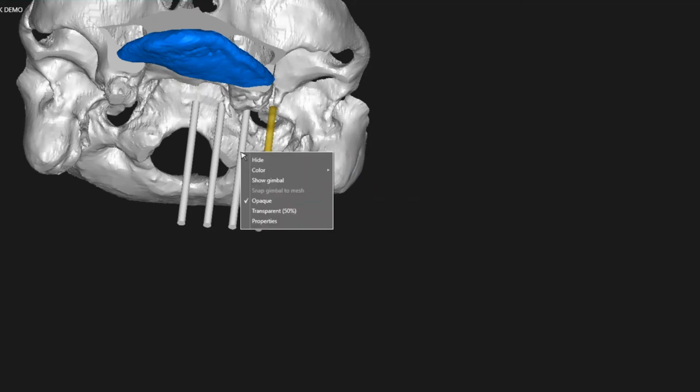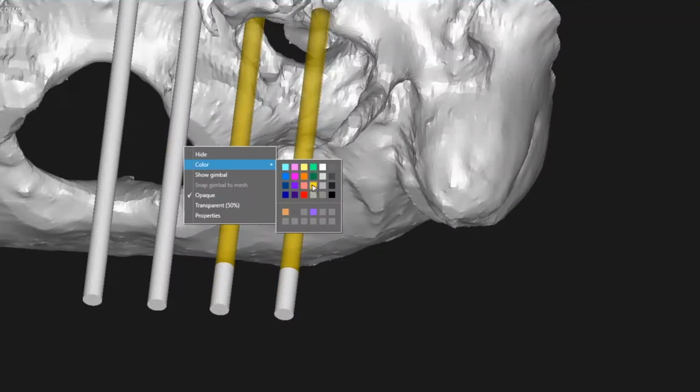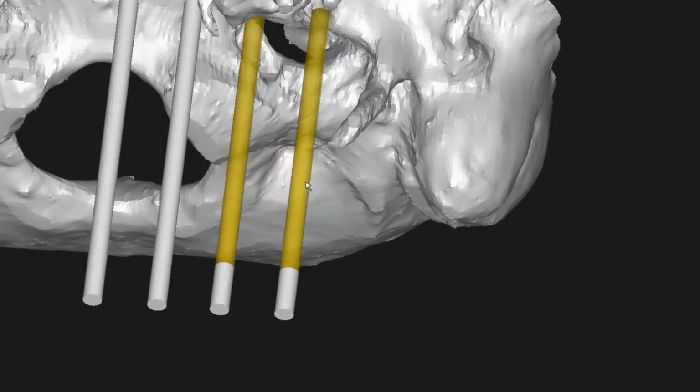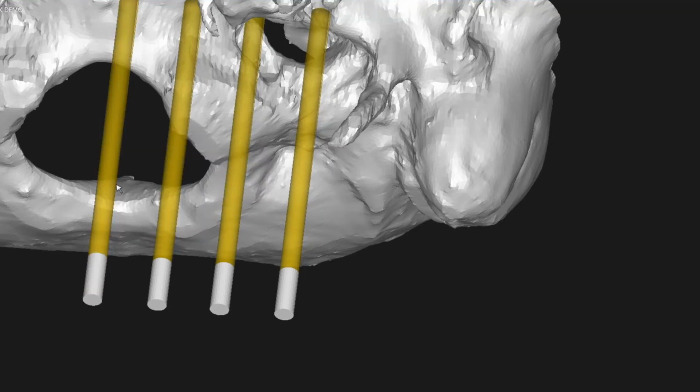The other thing that will be useful to have on this is the position of the lower teeth. I don't know whether we can fictitiously make that. Yeah, I have the mandible in here, so we can use that, and I'm bringing in those longer cylinders as well, so we can make sure that we have the trajectory where you need it to be. And you said 4 implants, correct? Yeah. Okay.